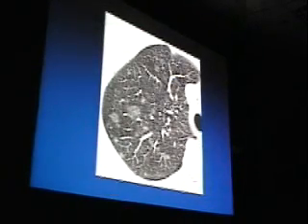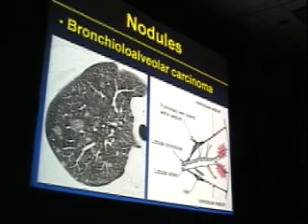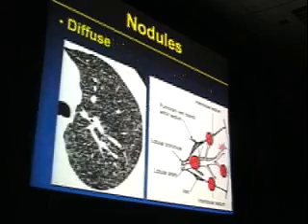Now, this case on first glance looks fairly similar. We see some ground glass nodules. Some of them are a little bit larger, that might be involving the entire lobule, like here. They look distinctly centrilobular in distribution. We might be thinking about EAA, bronchiolitis, and that sort of thing. And this patient actually turned out to have endobronchially disseminated bronchioloalveolar cell carcinoma. So I'll throw that out simply to point out that everything has a differential diagnosis, so you may want to keep that in the back of your mind, particularly if we don't have such a fairly homogeneous distribution of disease.